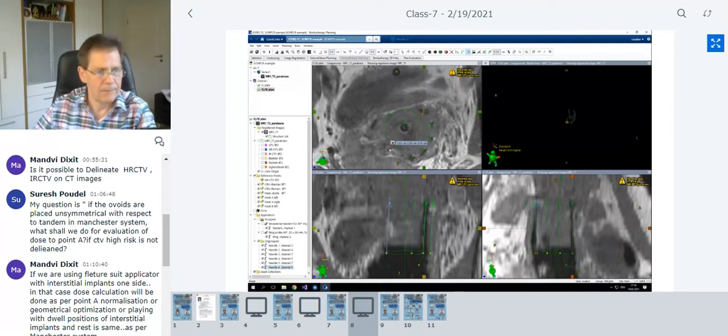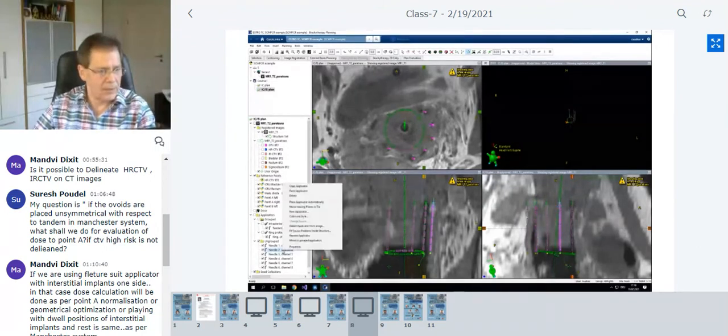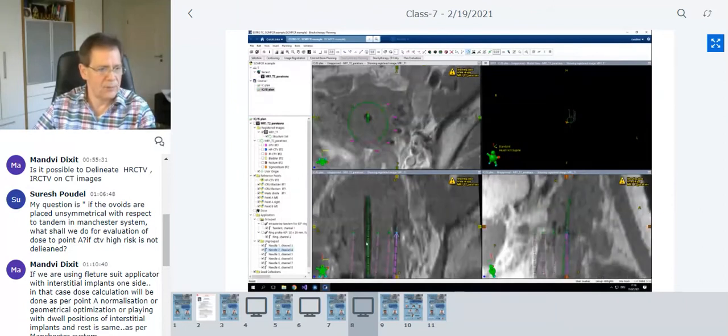Needle number 6 is here, over here. Good, because I copied them, they have the same source positions, but we can also change that if this is required. So now let's look at needle number 2. There is a nice tool. I can just right-click and ask, move the viewing planes to the tip of this needle, and then I'll deactivate the other needles because otherwise you're getting confused.